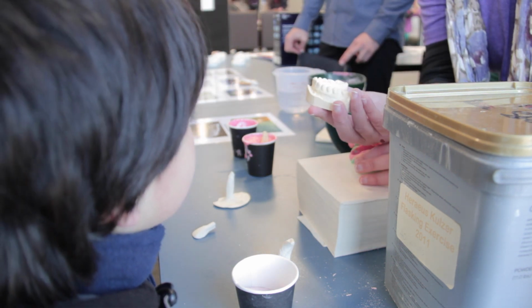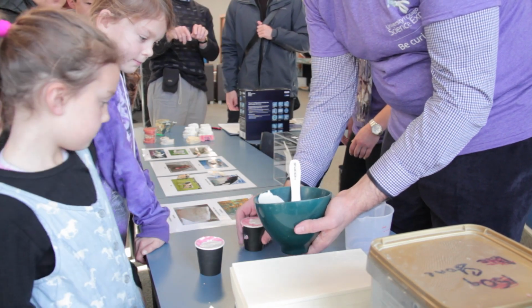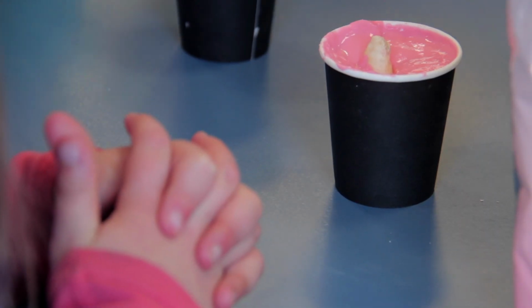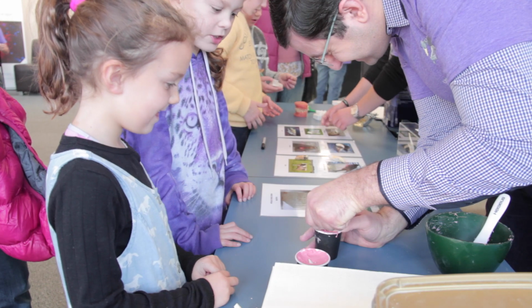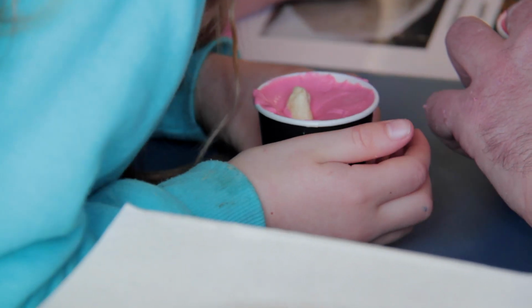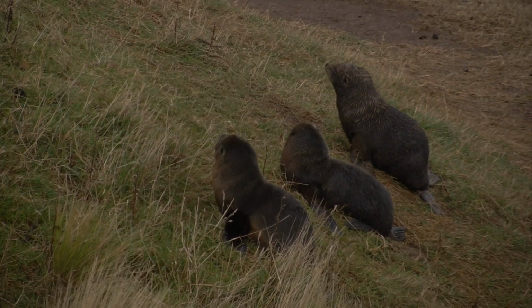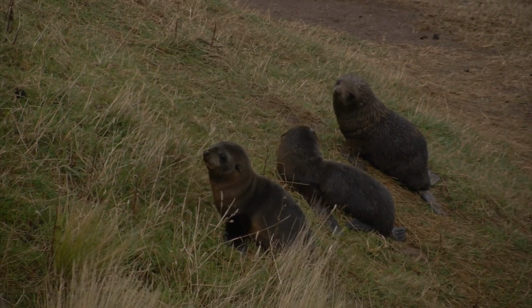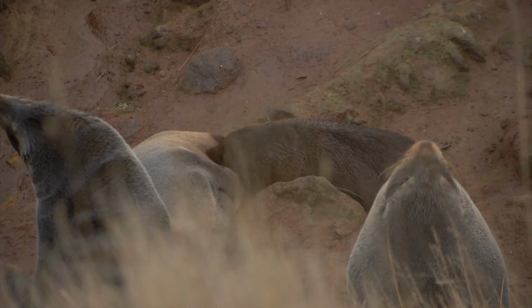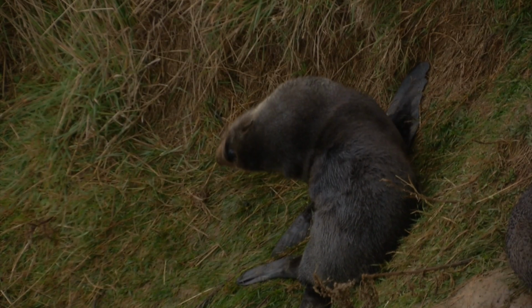I know it sounds a bit complicated, but you won't believe how easy it is to make a model tooth. And we're going to show you how to make an impression of a fur seal's tooth. You're probably wondering why we've chosen a wild animal. You may have seen fur seals around some of the beaches in Dunedin. These wild animals have very interesting teeth adapted to eating fish. They don't have as many problems with cavities as we do.